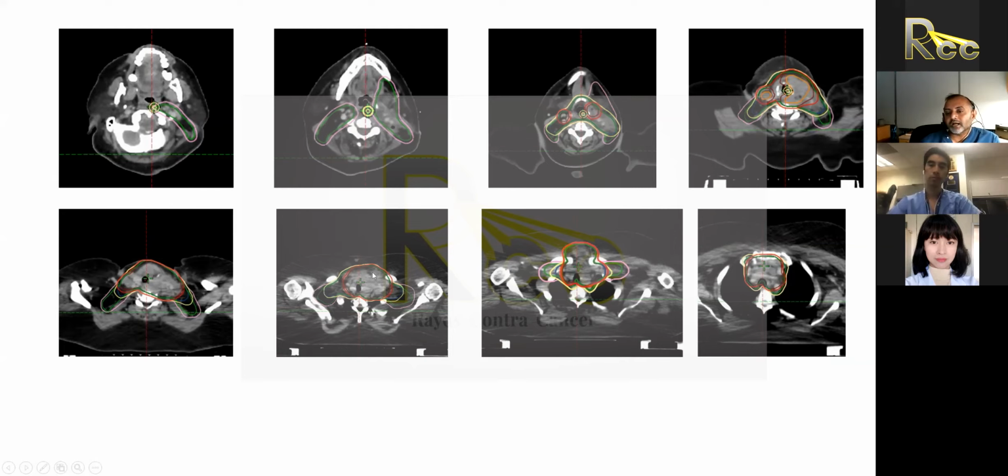You can see the entire thyroid gland, all of the trachea, all of the esophagus, everything is in the treated volumes. So you can see this was supposed to get 70 gray. This is the 63 gray volume. And then, again, generous volumes covering the 5B nodes, and really even now going into the upper axilla, going to 56 gray. And you can see this coming down here.